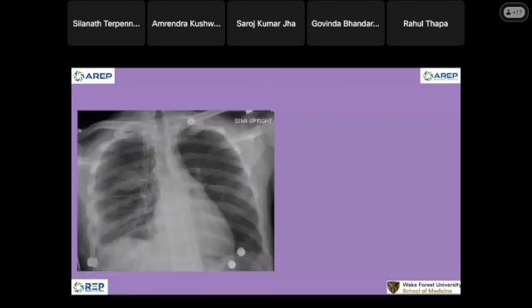It's about 3 centimeters. All right, what about this one? In the background, there are a few more holes in the lung. We're done for today, and the patient is a smoker. Tomorrow I'm going to show you this CT. This is an example of lung cancer, and I want to show you a comparison.